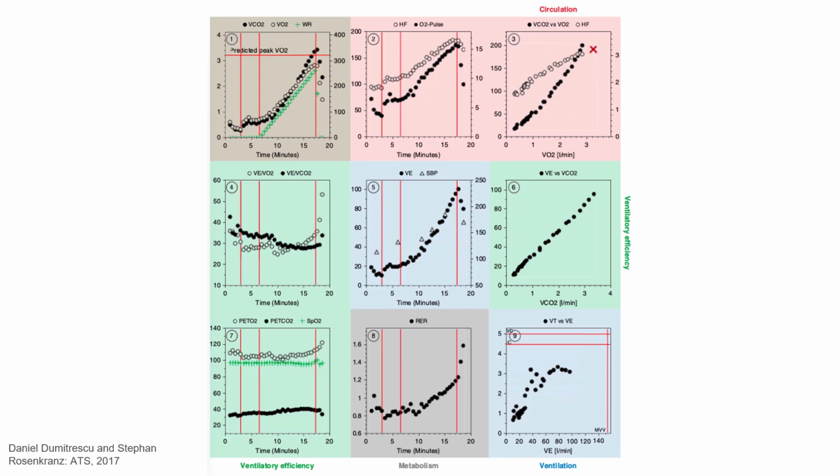This is the 9-panel plot. It has been rearranged in the last few years, but each of these panels helps us interpret the test in different ways. I'll be going through each of these panels throughout this video series, but today we'll just be focusing on a few of them.